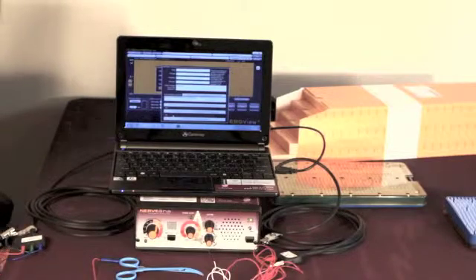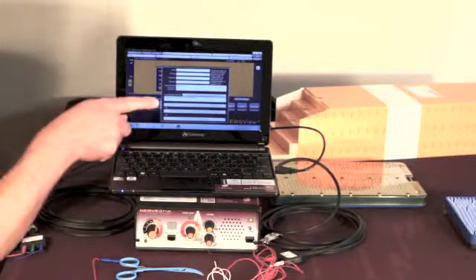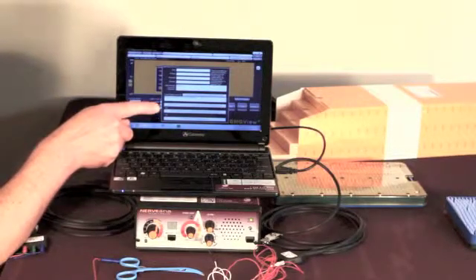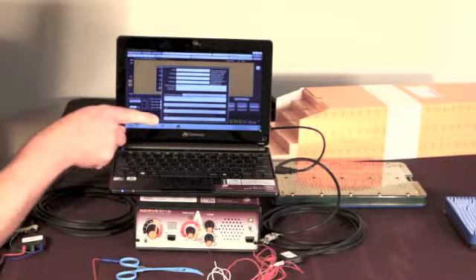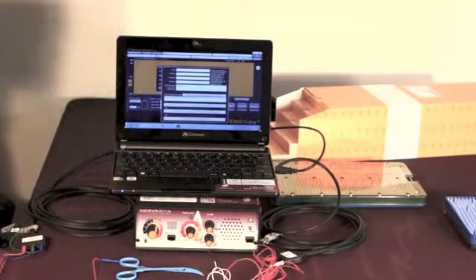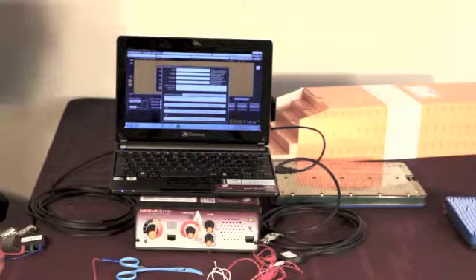You're next then presented with this menu, which gives you three options. You can either start the case and record the information, you can start the case and monitor without recording any information, or you could play back a file that was recorded previously. EMGView allows you to capture and record on your PC all of the data that was captured by the Nirvana during the surgery.